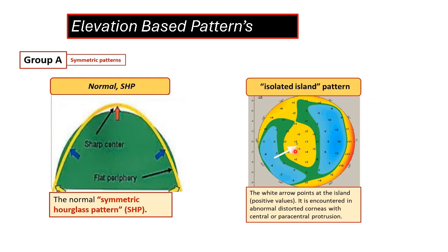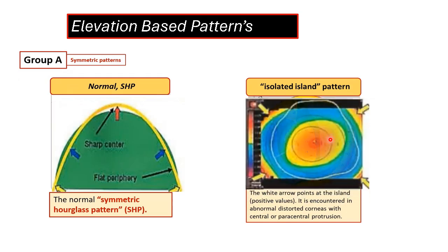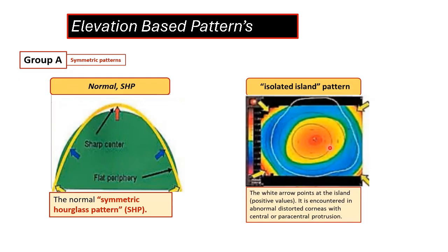So this is also a normal pattern, but this is a spherical cornea, and the previous one was mild with the rule astigmatism. However, this pattern sometimes becomes suspicious if these findings and these colors are accentuated, like in this case, for example, this is accentuation of the central apex, followed by two colors, the red and then the yellow, so it indicates there are significant elevations in the center. So this is more suspicious of isolated or the nipple cone, especially the nipple cone.